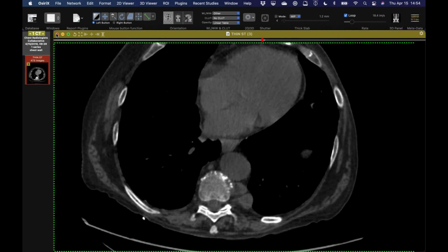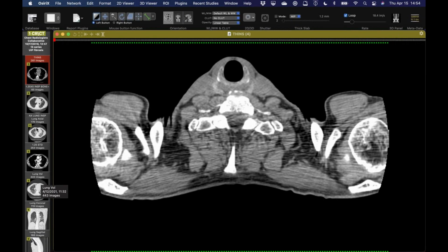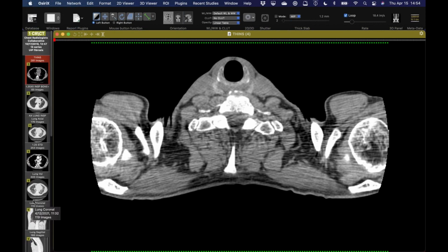Incidentally, one of my colleagues the other day said, "Oh, do you want to see this interesting case from abdominal imaging?" And it was a presacral lesion that looked like this. And he said, "We see this, and these are so-called myelolipomas or focal extramedullary hematopoiesis." So that jogs my memory, because apparently the abdominal imaging folks on occasion see this as an unanticipated finding in a presacral location, and it turns out to be a myeloid or myelolipoma lesion.